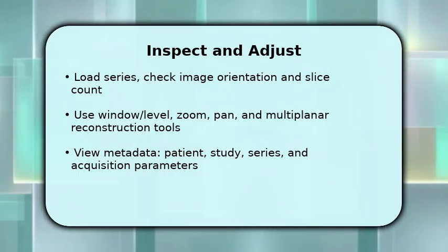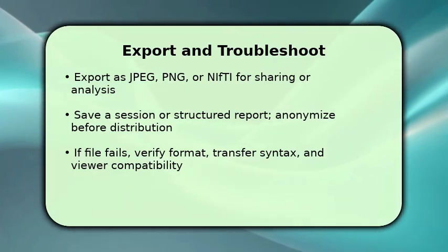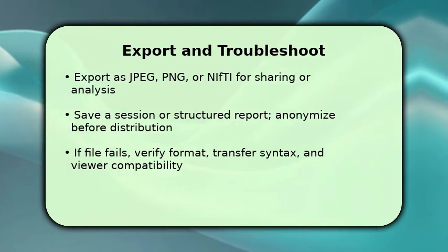To finish, export images or convert to a research format like NIfTI if you plan quantitative work. Use the viewer's export or save as function. Save your session or structured report and anonymize sensitive fields before sharing.